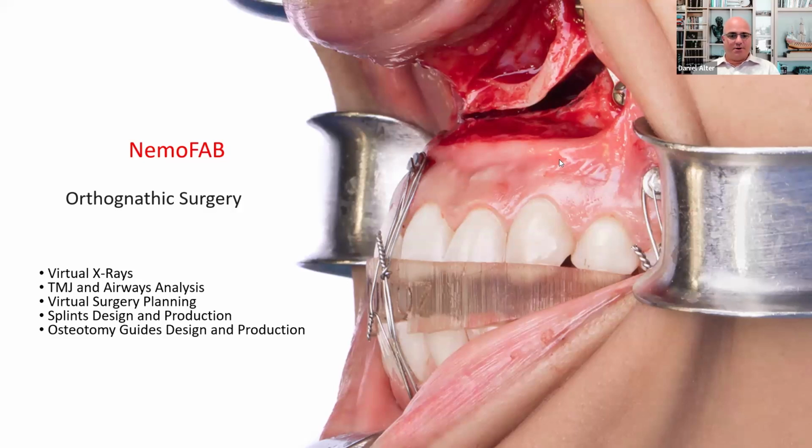Now, Nemofab is life-changing in many ways, and I'll share with you a quick video of those changes. But this is more orthognathic surgery, so you're able to change or move people's entire maxilla, their mandible, extend it, shorten it, the chin, osteotomy guides, and so much more. Everything that you can do with the same software, the same data acquisition, the DICOM as well as the static. Laboratories can engage in this. In Europe, they do, and here in the US, they can if they choose to, and they could offer a slew of different types of solutions for their clinicians.